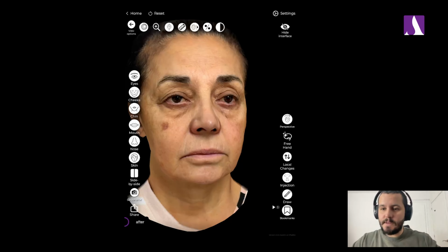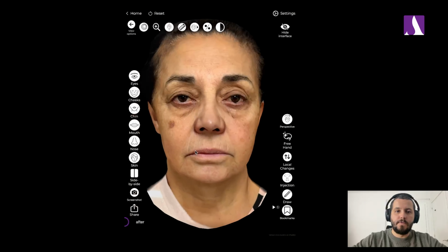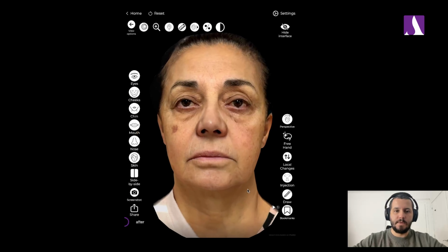I'm not going to treat today how to capture. This is going to be treated in another video. Okay, so let's start by having a look at what the possibilities are after we have scanned our patient.